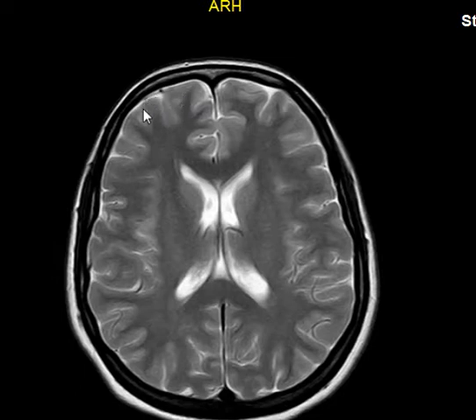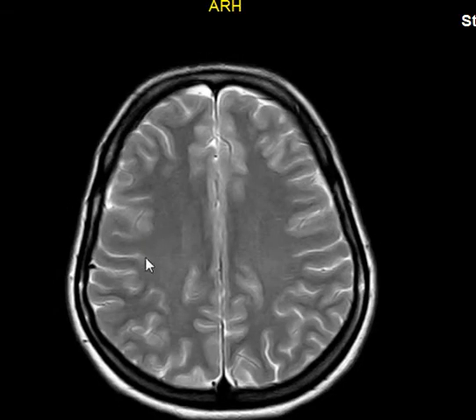They connect one gyrus to the next, one gyrus to the next. They are white matter, of course. They are fibers, not neurons, dendrites and axons, myelinated nerves connecting each gyrus to the next. These are called the subcortical U fibers. There are a lot of pathologies that specifically affect the subcortical U fibers. You need to know that.